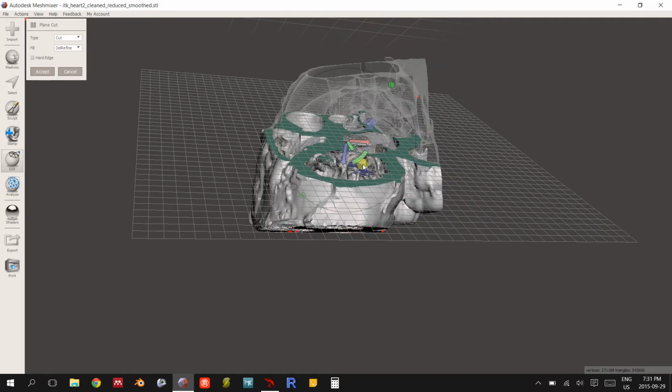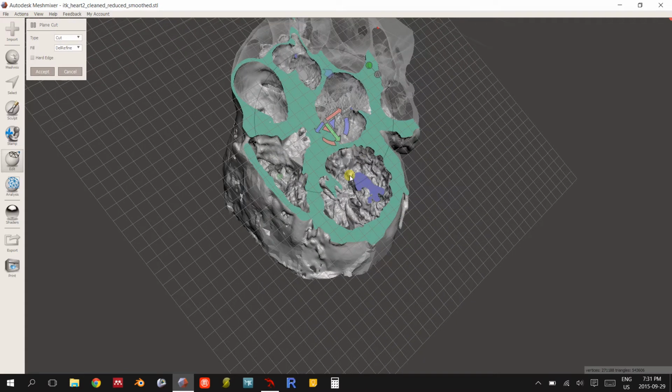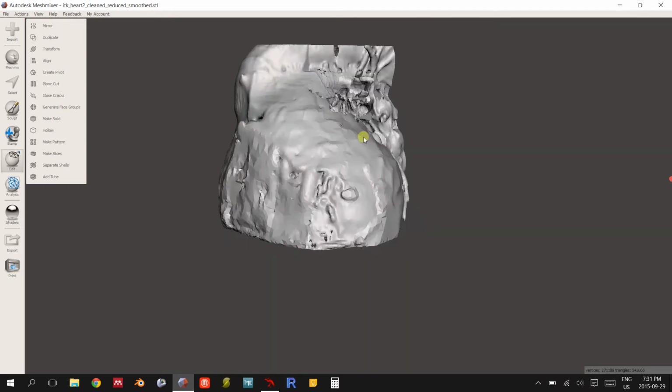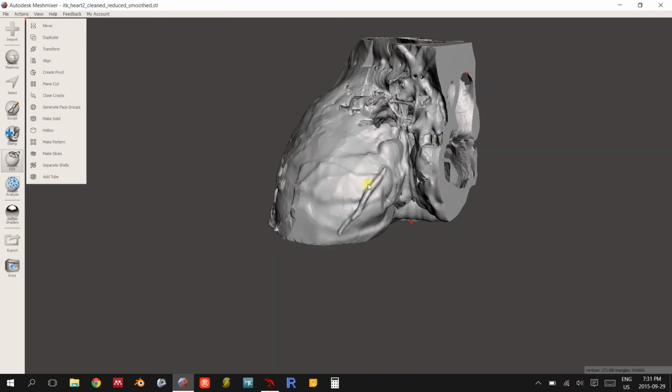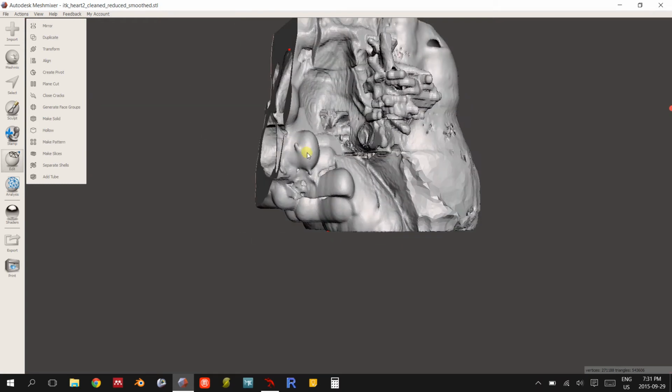There. So it's more complete than either one of the two models that I've done so far, and this was done much faster as well. The surface features are pretty good. You can see some surface veins. There's some weird blobs here. That kind of comes with the territory for manual segmentation using ITK Snap.